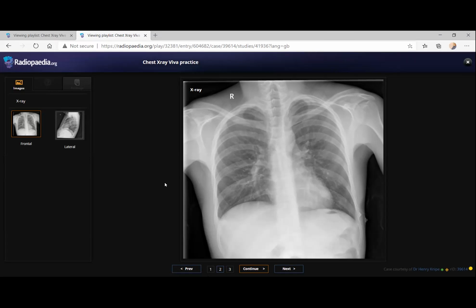Time's up. Okay. The patient is a known case of melanoma, and it's a melanoma metastasis. So you correctly picked up that nodule. So it's a review area. Usually it's a relatively normal film, so when you see a relatively normal film, don't get embarrassed. Go systematically, as you told, and say what you are thinking. You did very well, saying what you are looking at, like apex, retrocardiac area, and there's a nodule, and so it's a solitary pulmonary nodule.